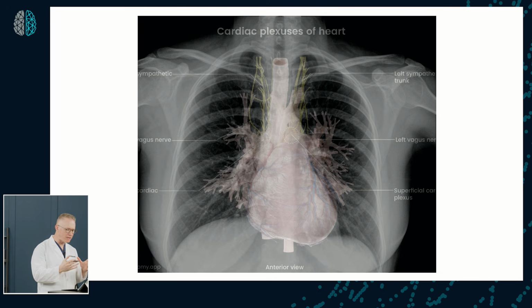What are those anatomical markings and locations that make sense of the borders and the chambers that we're looking at? That's the point of this topic review, so that you could say, oh, okay, I think that curve or that formation right there is probably this portion of the heart or the vessels associated with the heart.